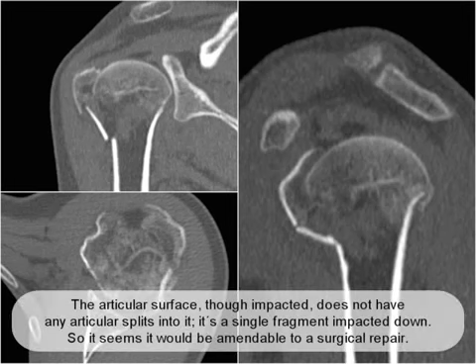The articular surface, though impacted, does not have any articular splits. It's a single fragment impacted down. So this certainly seems one that would be amenable to a surgical repair.